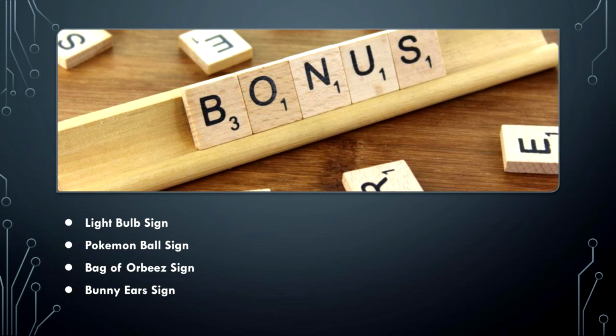All right, so now on to the bonus round. Now these are signs that are known, and I just want to talk about them because the title was 5 gynecologic signs, or maybe new signs, new proposed signs from things I've seen. So let's go right into it. The first one is going to be the light bulb sign.